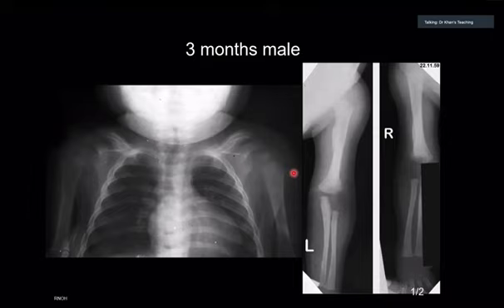And you have to understand what kind of films can come in the exam and how you will tackle the viva. As I told you before, anywhere between 9 weeks to 5 months, this disease will initiate. Basically, there is periosteal reaction. Within the long bones, it is thick periosteal reaction, and it can be around the diaphysis mostly.